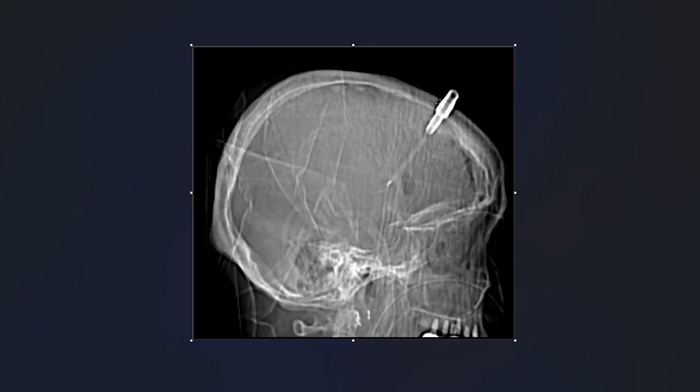So how do I bring this all together? There's a finding of pneumocephalus and gas within the ventricles, which is something that we certainly have to explain. But in the context of an exam, the answer might just be related to instrumentation. So placement of this device could introduce gas into the cranial vault as well as the ventricles.